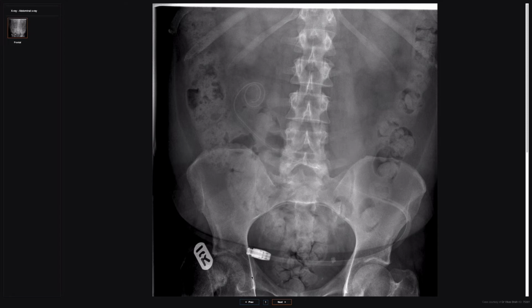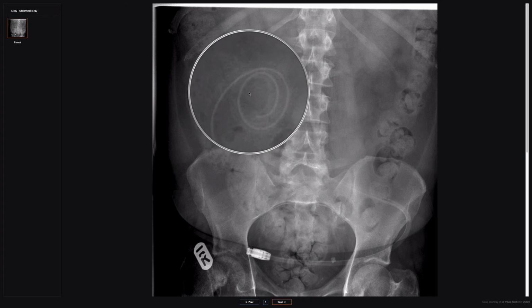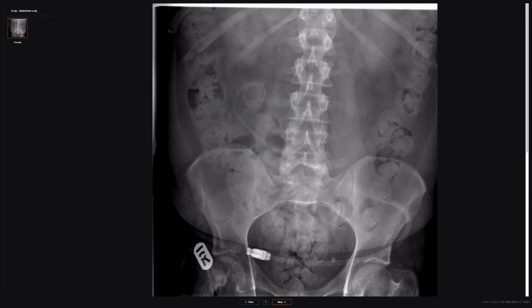Maybe ineffective dialysis, just to check: has there been a fracture of the tubing, is it still appropriately placed within the abdominal cavity? So you will see this kind of tube, which is variably located, with this curled ending within the abdominal cavity somewhere.